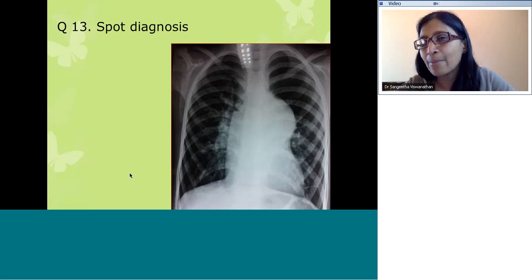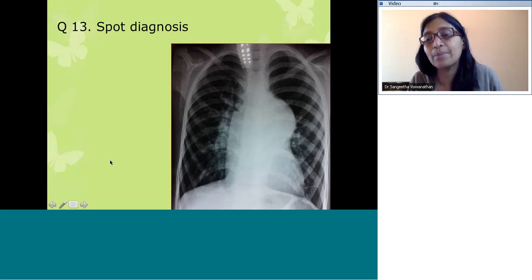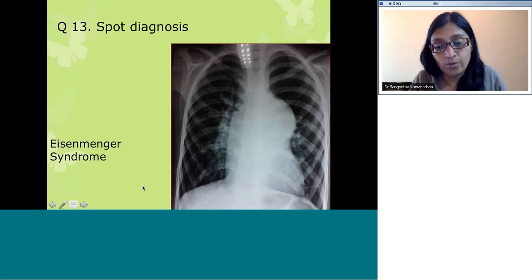More than pulmonary embolus, it's thrombus in the pulmonary artery, which develops within the dilated pulmonary artery because of the poor flow and stasis plus the potential coagulation abnormalities, if they are cyanotic, etc. So what is the investigation they would require if you're suspecting a pulmonary thrombus? Yeah, so they would require a CT chest to look for pulmonary thrombus.